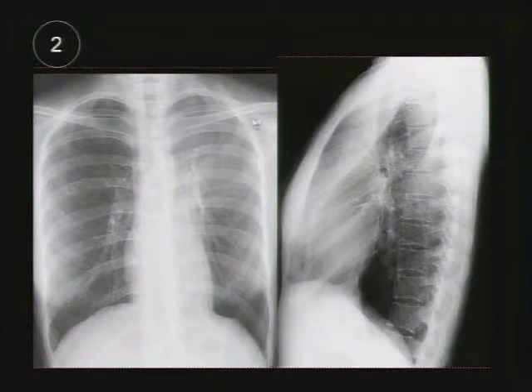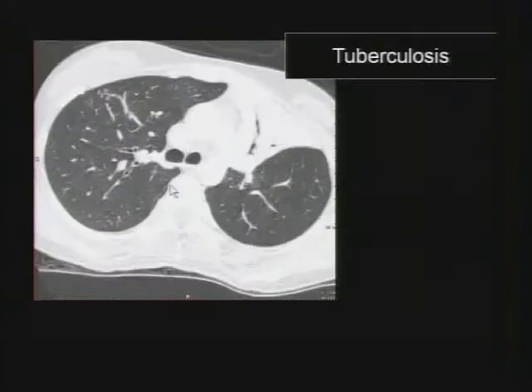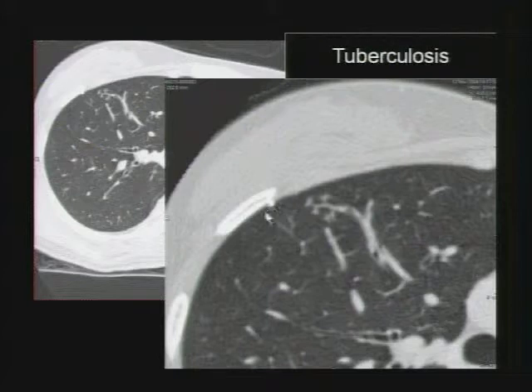What is the haziness here and the anterior density on the lateral film is classic for what? The left upper lobe collapse, right? And if you look a little bit closer, you can see that there's a granuloma here. And if you recall the CT scan, you can see that there's a calcified pleural granuloma or pleural base granuloma and a tree and bud appearance of the small airway disease peripherally. So this was a case of tuberculosis, something unfortunately we still see fairly frequently.